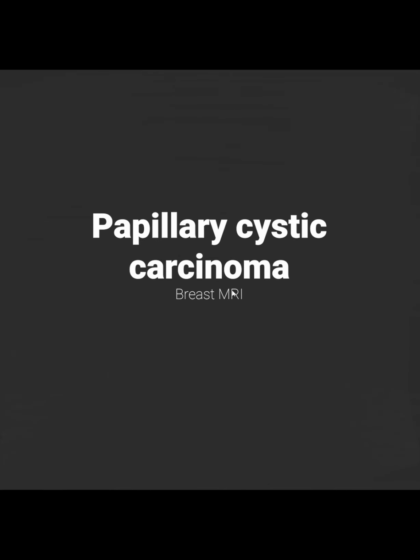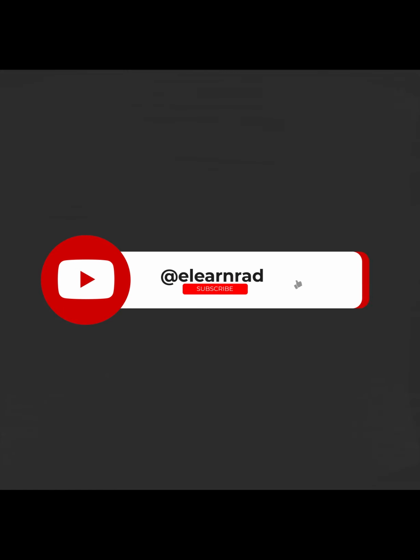65-year-old lady, a treated case of right breast cancer, now presenting with a mass in the left breast. The ultrasound and the mammography demonstrated a large mass in the left breast, which has solid and cystic components, and the fine needle aspiration cytology raised suspicion of a papillary neoplasm. So let's look at the images of the MR mammogram.